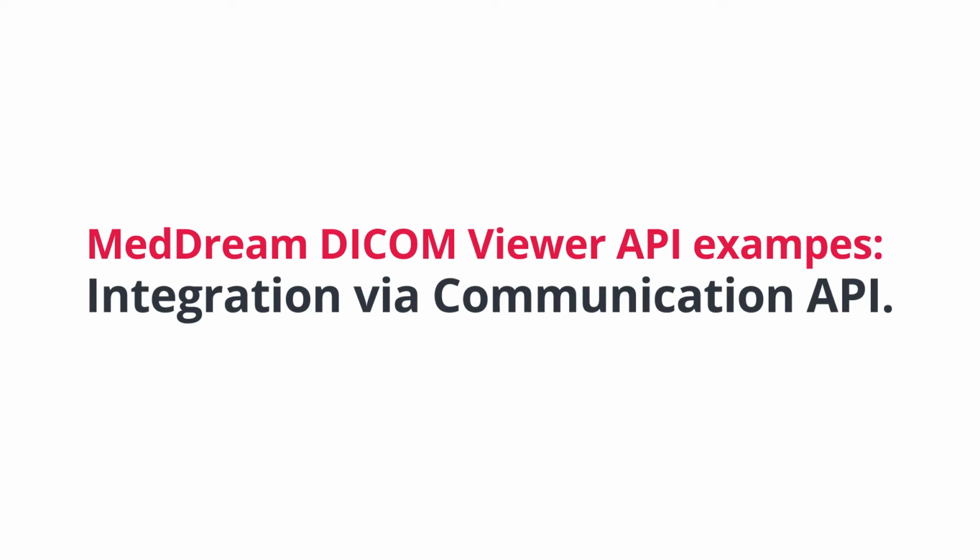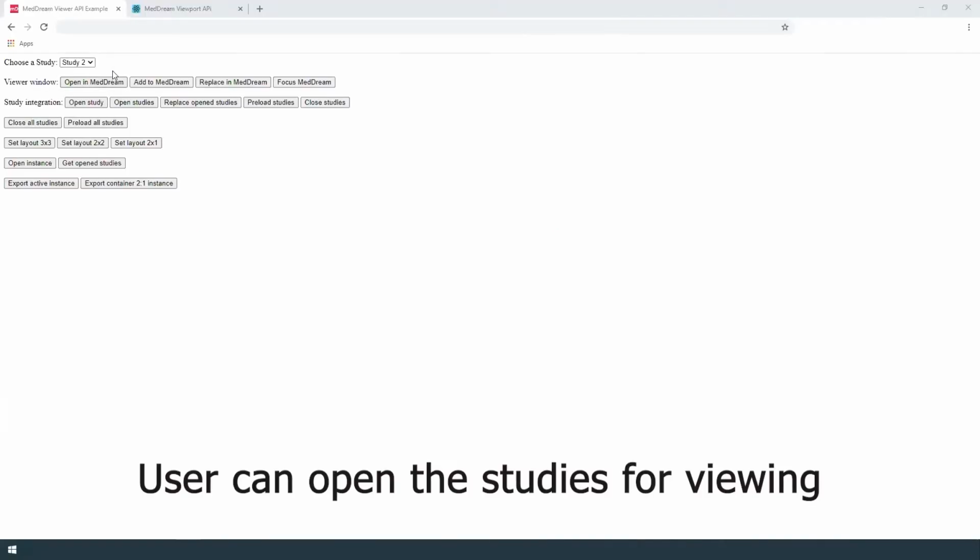MedDream DICOM Viewer API examples. Managing the viewer from client's management system side. Possibility to manage MedDream from external system side. This is Hospital Information System page sample.